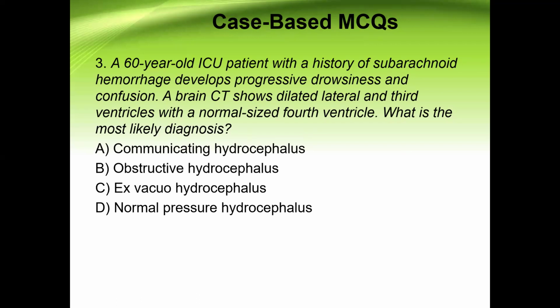Yes, that shows hydrocephalus, but what makes it obstructive and not normal pressure or communicating hydrocephalus? Because the size of the fourth ventricle is normal. Beautiful. So what do you think is causing this? Most likely a mass effect. Yes. What is the other name for obstructive hydrocephalus? Non-communicating. Correct.